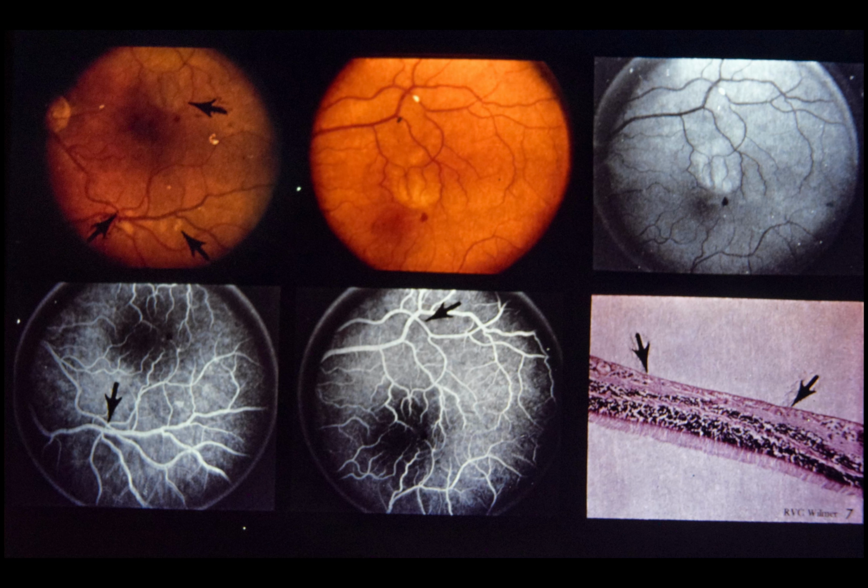Slide 7. Multiple embolic branch retinal artery occlusions. This 42-year-old hypertensive white male had a history of myocardial infarction and stroke. He noted acute loss of vision left eye. Upper left, note cotton wool spot and superficial retinal hemorrhage above fovea. Also, note yellow plaque in inferotemporal branch artery with cotton wool spots in distribution of obstructed vessel.